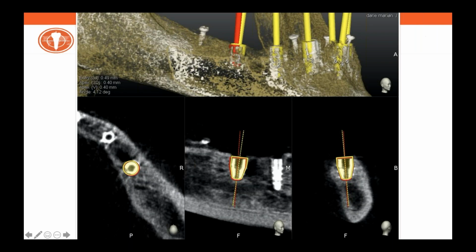As you can see, you see a 3D rendering of a jaw, and you see two pictures, yellow and red. The yellow implant shape pictures are the planned implants. And you can see that from the head of the yellow shape starts an axis, which is the implant axis, which has been according to the plan.